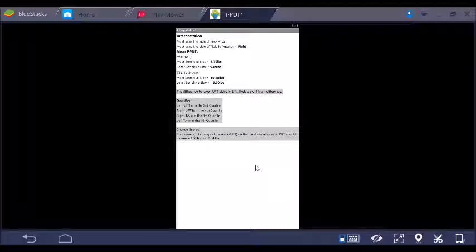One of them is that it's comparing your patient's scores to a normative database of now about 400 people. And so what it does, first of all, is it tells you that the most sensitive side of the neck is the left side. That's the one that has the lower side, and you can see where it got that down here. Most sensitive side, left, 7.79 pounds. Most sensitive side of tibialis anterior is the right side at 10.88 pounds. It again shows you your means for your most sensitive and least sensitive sides. And what it does here is compare those.